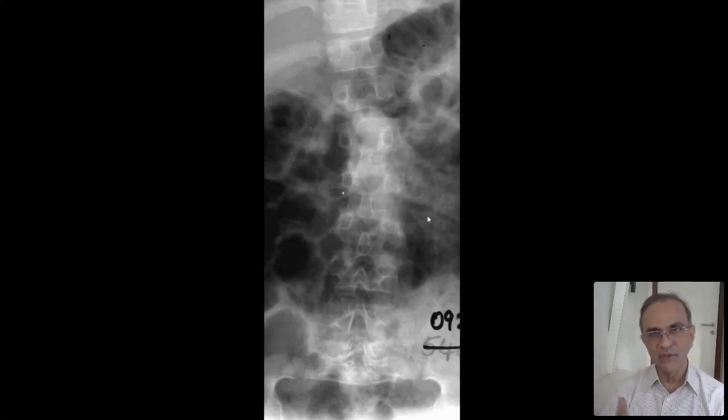But if you have a patient who has a skeletal dysplasia and you have a lumbar spine AP X-ray, I said do lateral at the beginning, but if you do have an AP X-ray, look at interpedicular distances, okay? I assume you know how to measure interpedicular distances. Listen to me carefully. In normal human beings, without exception, the interpedicular distance increases from L1 to L4, not L5, L1 to L4. L4 is the widest interpedicular distance in normal human beings, and L5 may be the same as or smaller than L4.